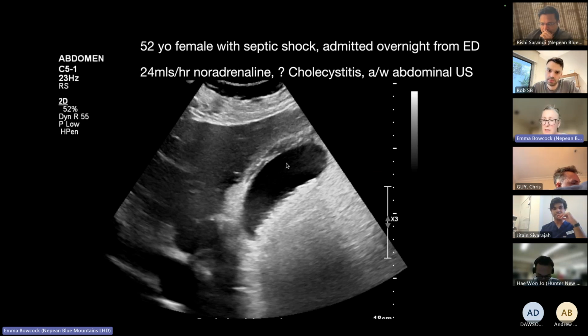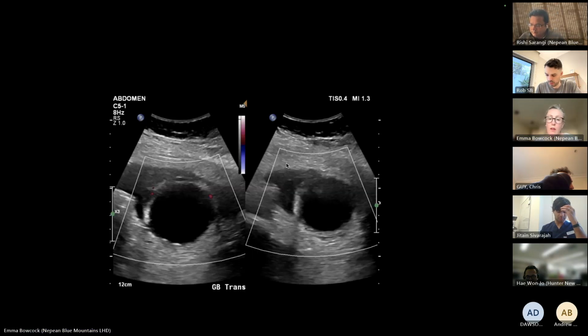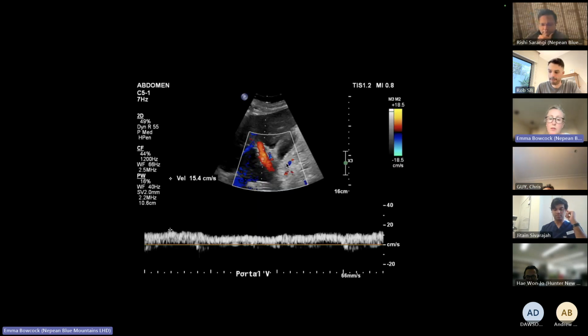Sometimes that's easy. So just make sure you have a look at a few pictures that show that big gallbladder in the neck, like an obstructed gallstone there. Know a little bit about the sensitivity and specificity of each of the signs, because obviously none of them are perfect. I think Murphy's positive is probably one of the better ones. Just remind you that there are tables in the books about the performance of those particular signs. Thank you. Cool. All right.